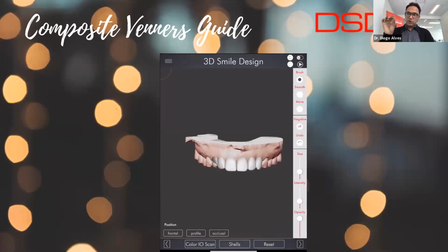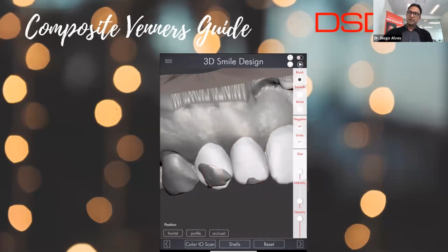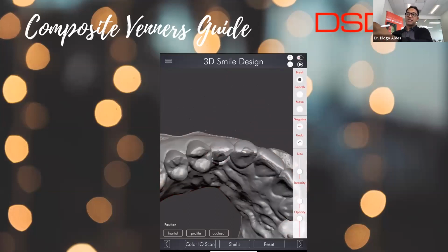And then in the sculpt tool, what will you do here? You will be now deleting, erasing this teeth that is going through that 3D design. Look at that. Wow. So basically, this is like after you prep on the patient's mouth, you will be now either preparing, or you can do that after you prep it.